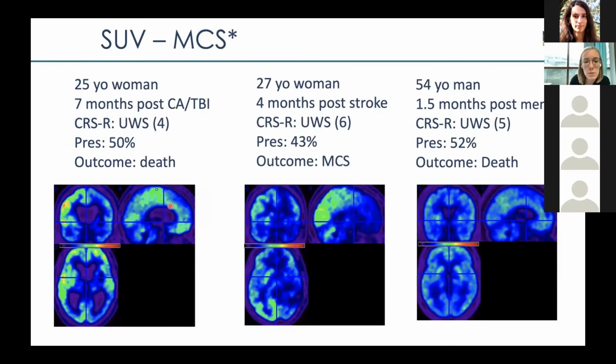Also, if you look at the images, you see that it looks quite different from the first patients that we saw, where we could basically see only a very blue uptake across the whole brain. And one of these patients actually recovered to also show behavioral signs of consciousness after the PET scan, and 2 other patients died.